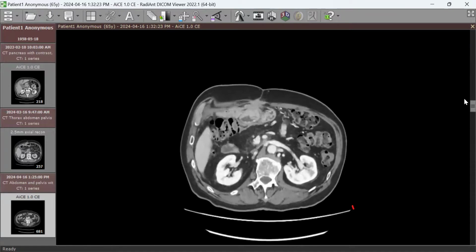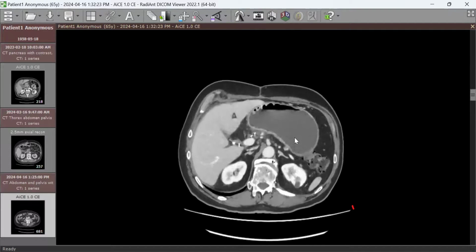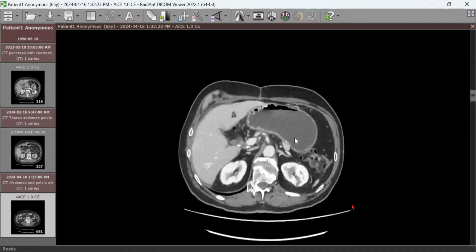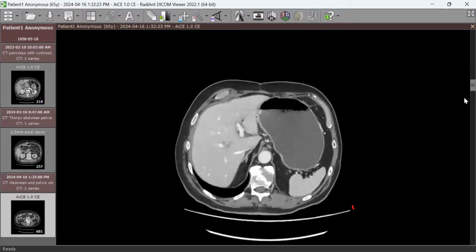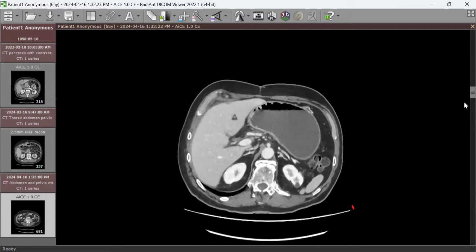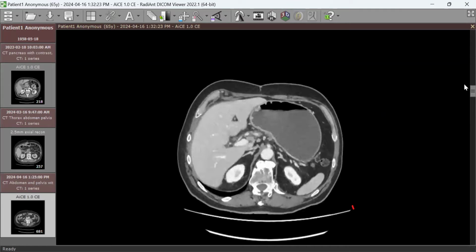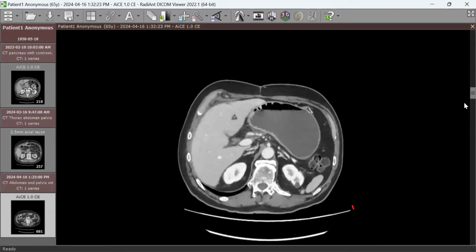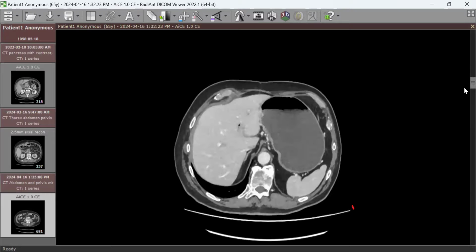The gallbladder is not here. Cholecystectomy, that's number 2. Number 3, look here. Look at the biliary radicals, biliary ducts falling here to this bowel and going down. That's hepatojejunostomy. Okay, so that's the 3rd component. And the 4th component is what to do with the rest of the pancreas.